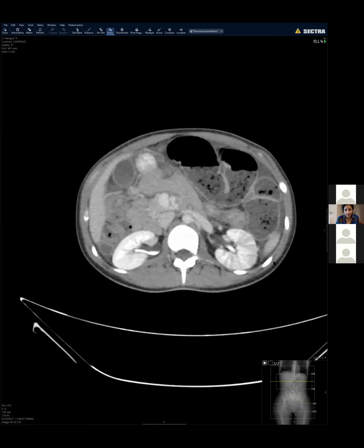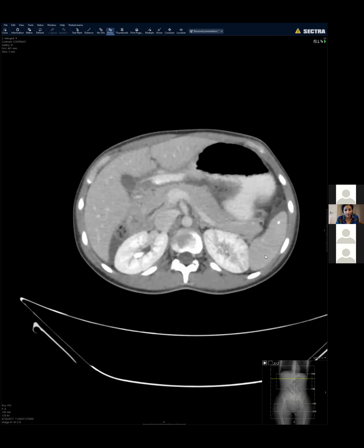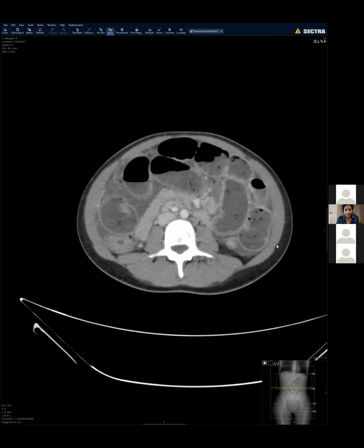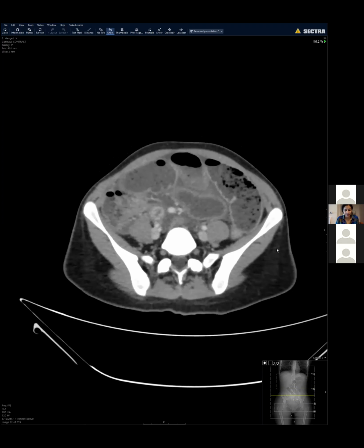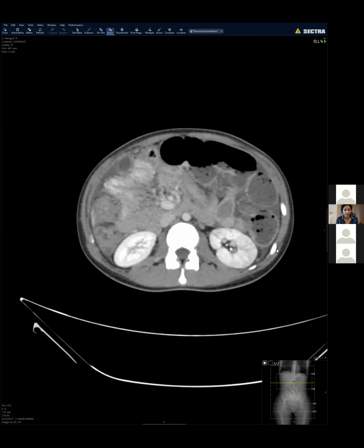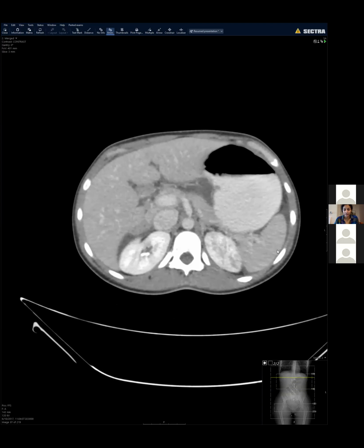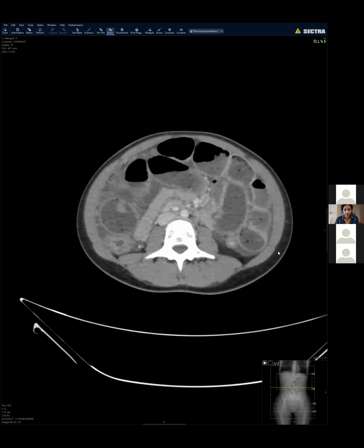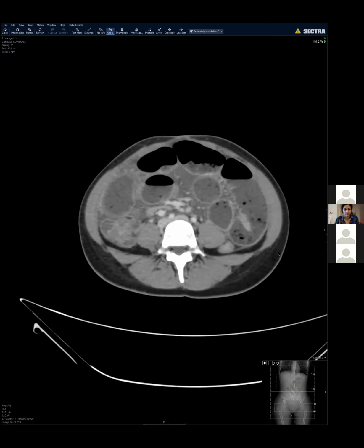And when we look at ovaries, always also by habit look at the omentum and other structures, which all looked clean. There was no regional lymphadenopathy, there was no ascites, there were no effusions, no nodularity anywhere. They actually ran a CA125 on her, which came back at 85. Upper limit of normal is up to 25 based on this reference standard.